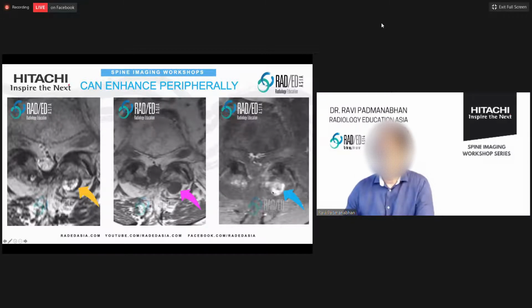And the other important thing, because the question will always come up, is this an infected cyst? Is it inflammatory? Is it infected? We'll look at infection towards the end of this talk, but one of the things is that when you give contrast with infection, generally you will see the peripheral soft tissues around the cyst also enhancing, or they will have inflammatory change. It would be really unusual to have an infected cyst and not have any soft tissue changes around it. So that can also help you.